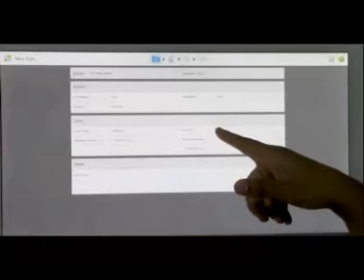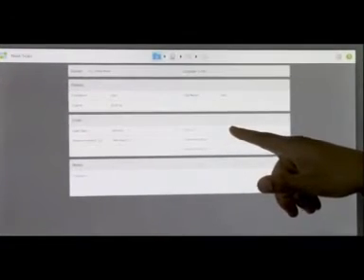Now, once you've got your lab set up, once you've given me the information that I've asked for, you'd be able to send directly to your lab. As soon as you scan, that scan will be sent to your lab. I think it takes about maybe 24 hours to go straight to the lab because we clean up the scan before it goes to your lab. Oh, okay.